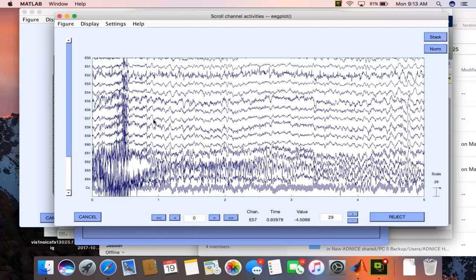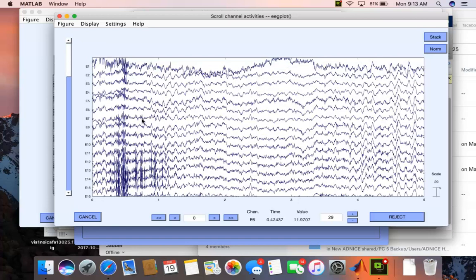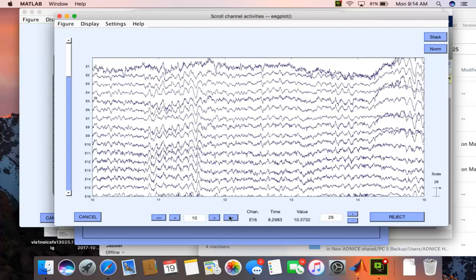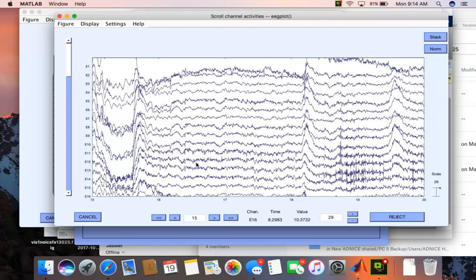Sometimes the beginning of your data set is a little skewed, because a lot of times the instrument is sort of settling itself and you've got some stuff going on. So we'll skip over to about the 8th or 9th second. Now you can see there really is a big movement here in the data. It looks pretty uniform, and then all of a sudden something goes haywire and you get quite a bit of what looks like noise, and it's time localized. And here's another one.